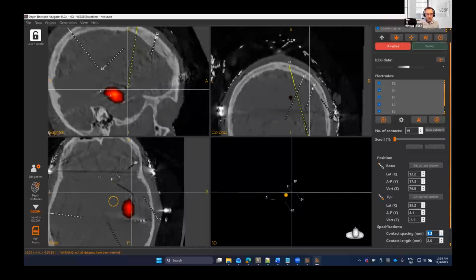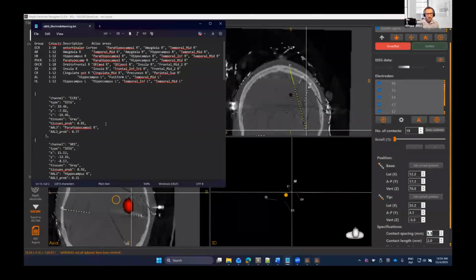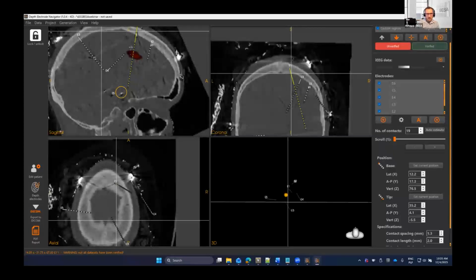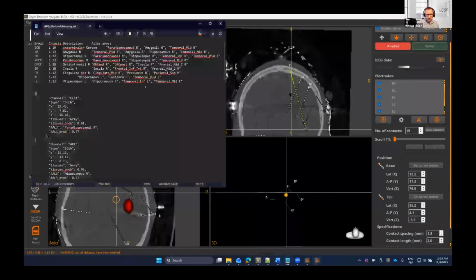And then we need to figure out what is the name of this electrode. And this is, let's say, a bit tricky part because we need to use the information that we get from the hospital. Here, this is the electrode that goes from the frontal lobe to the very deep structures. So let's see what electrodes we have that go from the frontal. We have these 2 electrodes that go through frontal, but one ends in the insula and the second ends in orbitofrontal, so a bit lower.